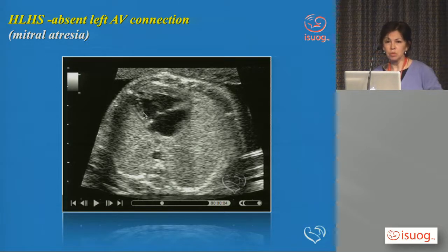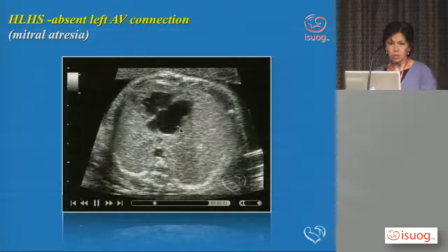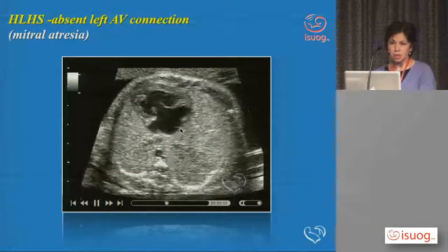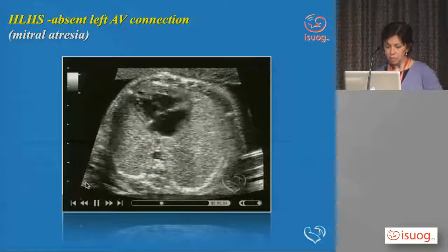You can see 2 ventricles if you don't slow down the image, because this is a big apical papillary muscle in a very dilated right ventricle. So you could, if you're not very careful with screening, even a case like this, which is very clearly one single valve, you could stop and print an image and say, but I can see two ventricles of equal size.